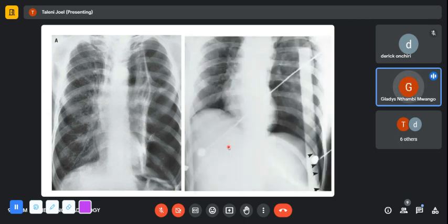What do you think about the lung volumes, in terms of what the underlying disease in this patient was? And even the cardiac outline size? An emphysematous process, because these lungs are hyperinflated. Mainly emphysema, and even the cardiac outline looks small. Yes, it's on the smaller side.